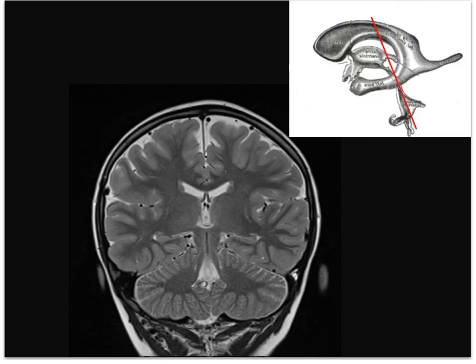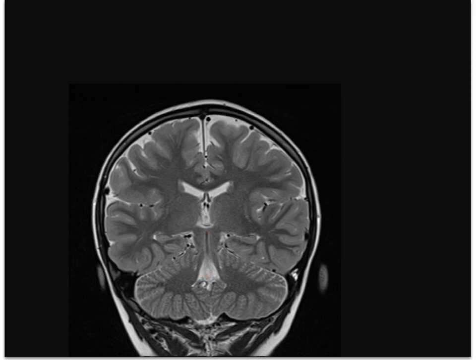At this level, the dotted line in the midline is on the cerebral aqueduct, which connects the third ventricle, not visible on this image, with the fourth ventricle, noted by the red arrow. Superior cerebellar peduncles are much less bulky than the middle cerebellar peduncles.